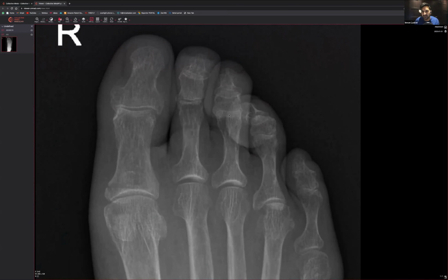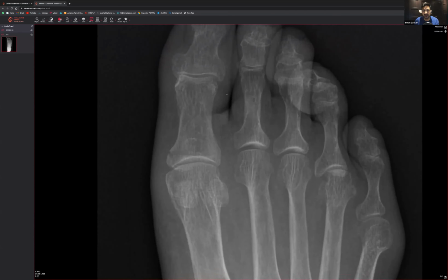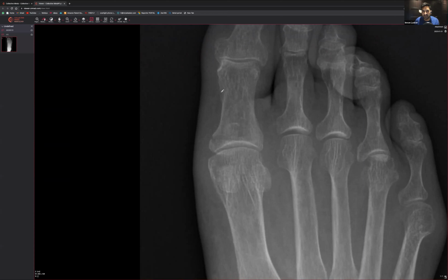Let's have a look at the rest of the shafts. No fracture, no fracture, no fracture. Oh, actually, hang on. There is a fracture over here. Can you see that, going on like so? Big fracture, articular surface involvement as well. So that's definitely a fracture over there.